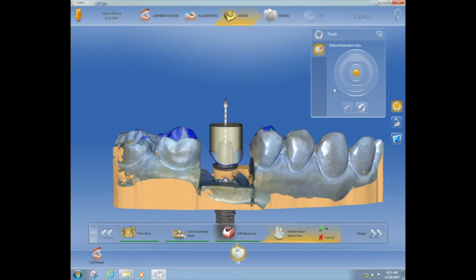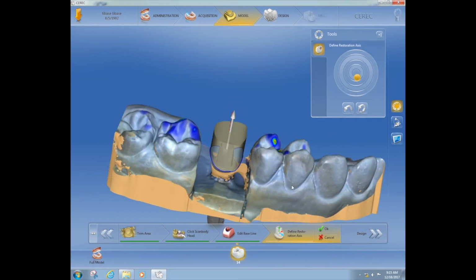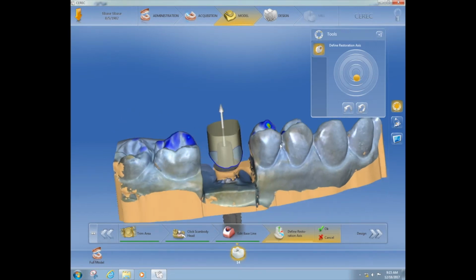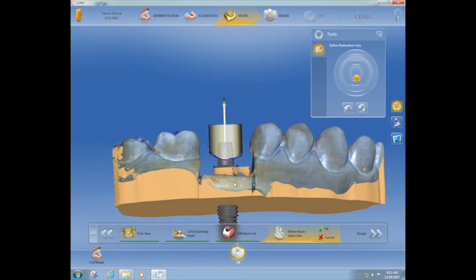To change it, you can do it up here. You see this little toggle button. You notice my crown or the path of draw is lining up, and I'm just changing that. You may have to change your rotation just to see that. I don't know if you noticed that a little bit. I did it for you to show you that you can go ahead and align those. Those do not necessarily have to be aligned. It's just that dotted line showing you the path of the implant, and then you're just lining up your crown with your adjacent contacts.